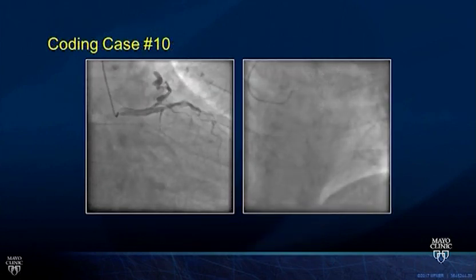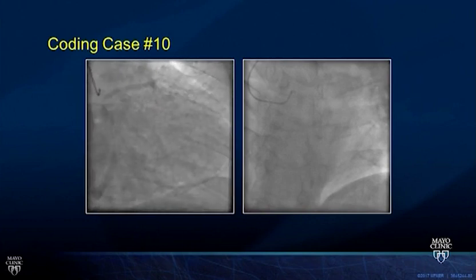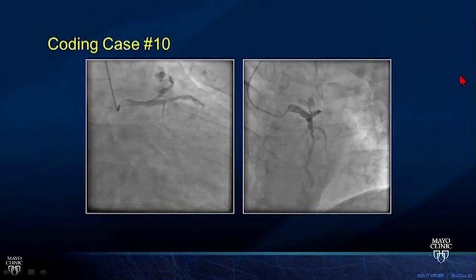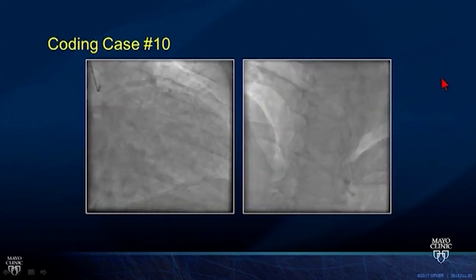All right, here's another case. RAO view here on the left and LAO view on the right. Let's see if you can get this one.